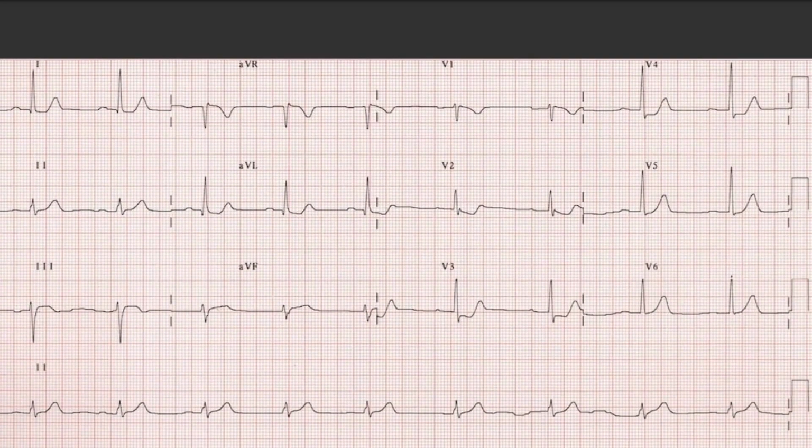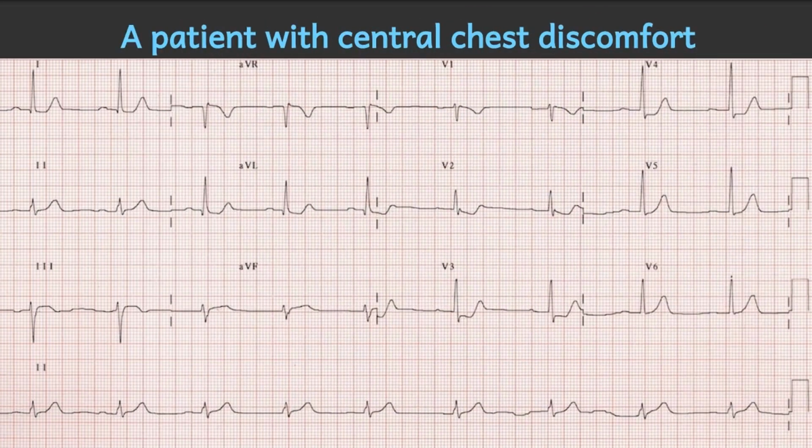And so now, let's see this ECG of a hypothetical patient, say a 65-year-old African male known to have diabetes and hypertension and has a smoking pack-year history of 36. He presented with a central and diffuse chest discomfort associated with anginal equivalents of nausea, diaphoresis, and left arm pain. Remember, we will have a full tutorial on ECG interpretation steps, but here we just want to identify ischemic changes. So this is a standard 12-lead ECG, of course without the posterior chest leads, and this is the rhythm strip, which is the entire length of lead 2.